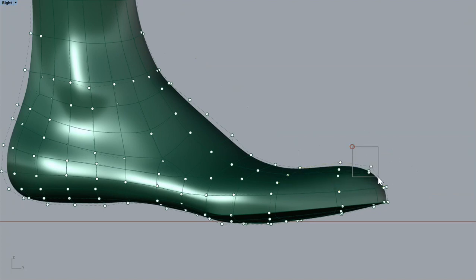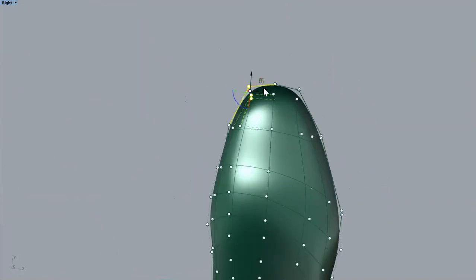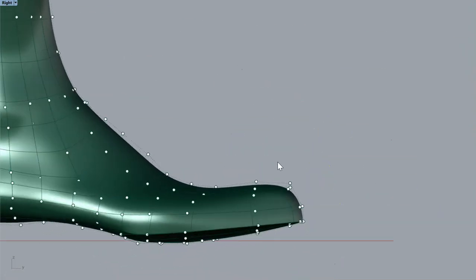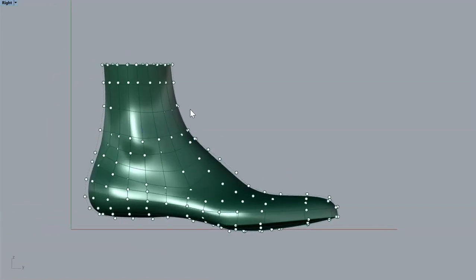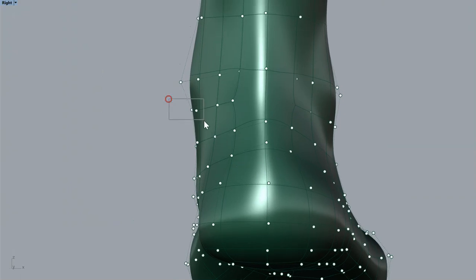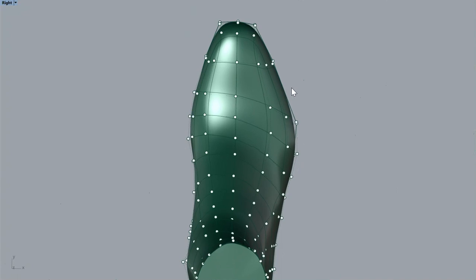We have extra room for the toe, or the curvature, the curves on the top to have a safety nose, for instance, steel nose cap. I can make it one like this. Well, anything I want. I can play around with it as I like. I don't need all kinds of nose types in a library. I can do it on the fly. Make this a bit higher. For instance, I want some extra room underneath the ankle to avoid pressure there. That's a common problem. What else can I change? I can change anything I want.